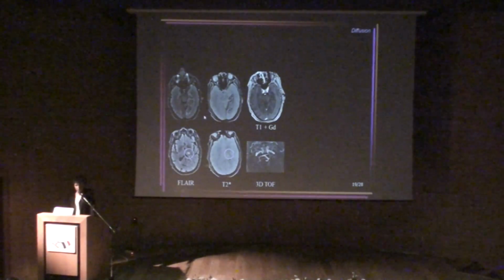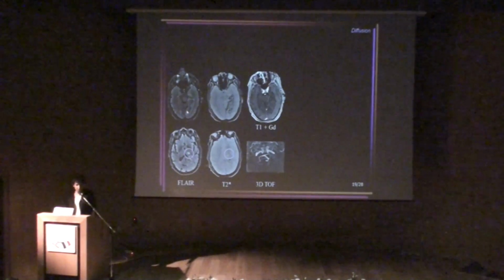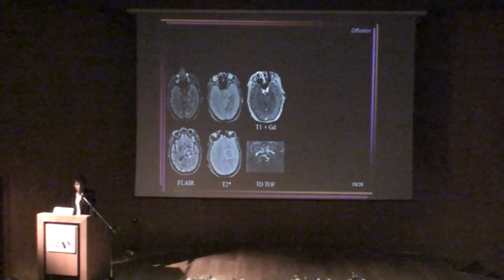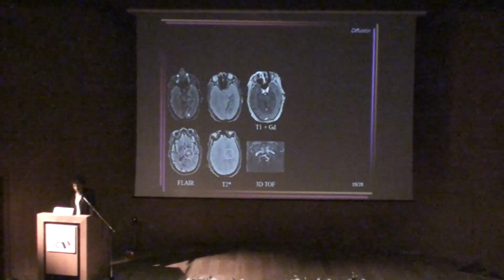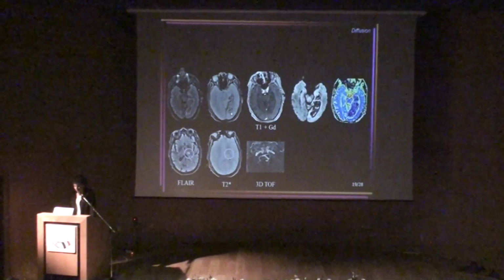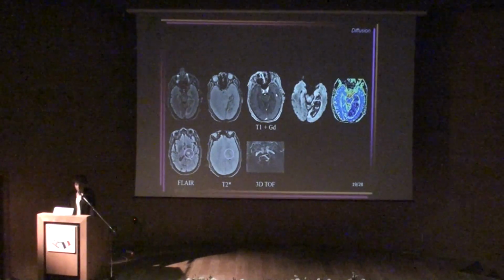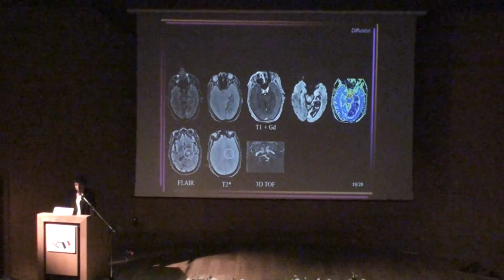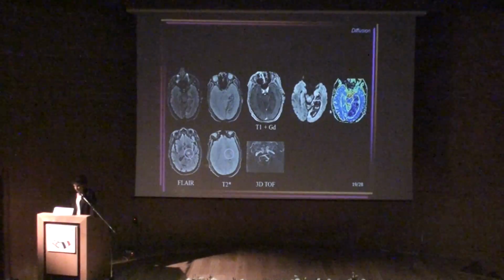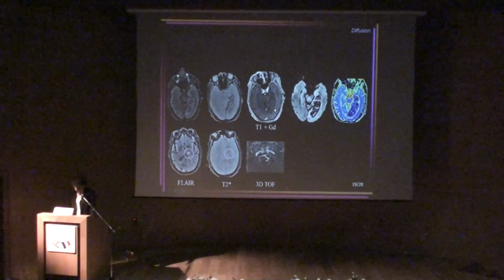In such a case, there is one possibility, that it's a simple hematoma. There is a second possibility, that it's an ischemic stroke in the vertebrobasilar artery, and that started bleeding in the occipital lobe. So maybe diffusion can be helpful here. If you look at the diffusion sequence that was acquired the next day, because we had removed the diffusion from the MR protocol, we see that, okay, it's heterogeneous at the level of the bleeding, not much information.